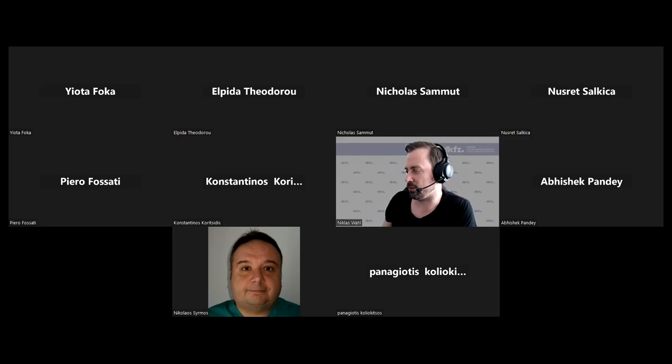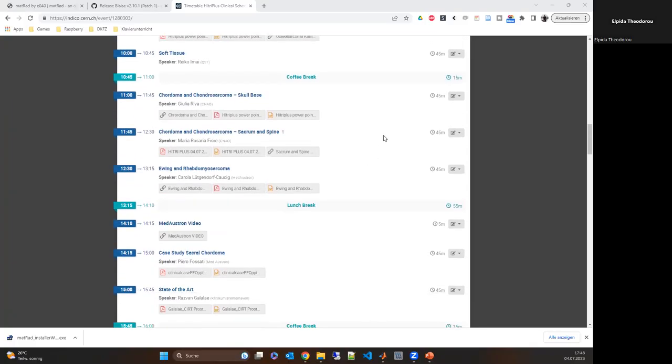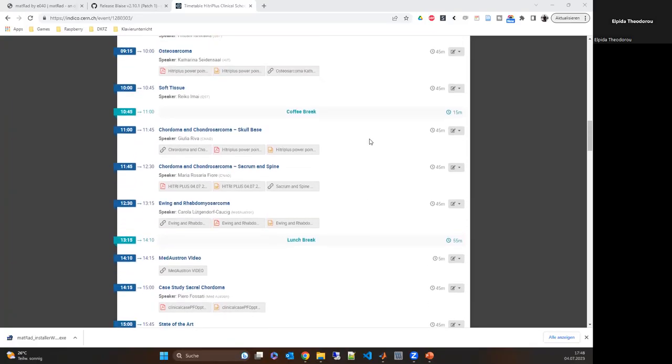Okay, so now let me start sharing my screen, and I can give you the first pointer. So if you open the website in Indico, so where you see the schedule, you will see that, and I hope everybody can access it.